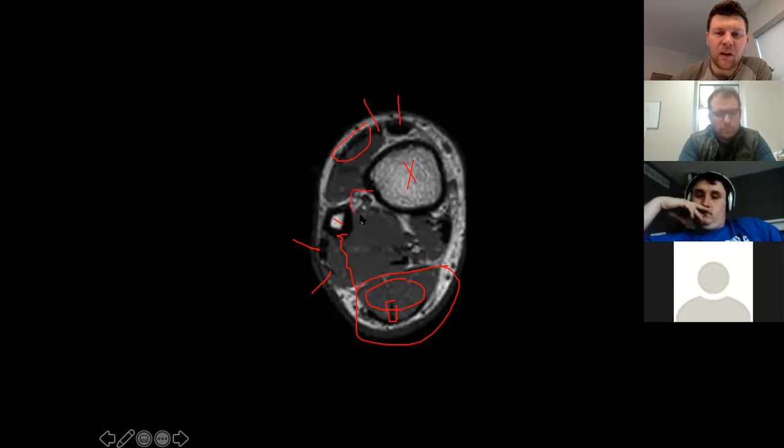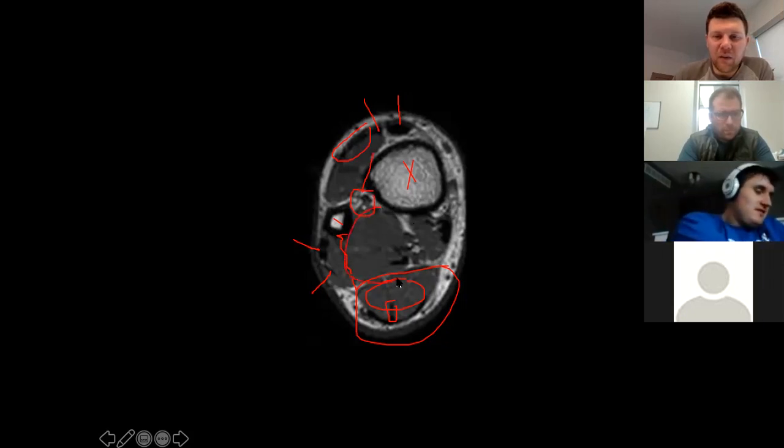So it's right here, right now, and eventually it's going to move its way out. Okay. If you want to pass, the next person can take that one on the next slice. Sure. Yeah, I have a guess, but I'm not 100% sure, so I'll pass on that. So other things, what is this muscle back here that has formation of tendon?